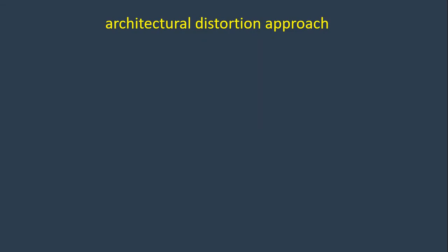And if the patient has previous mammograms, we compare with them. And then we can go for further imaging, like ultrasound, for example. If it's not conclusive, then we can move to MRI. So this is to establish that we have architectural distortion.